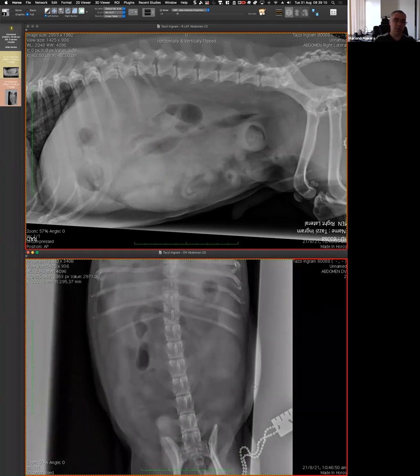So that is the price that we pay for having something so cheap and easy to do. And the price is quite big. Makes sense? We have a 3D object reduced to a 2D image. And most of the difficulties that we have reading a radiograph is dealing with that issue.